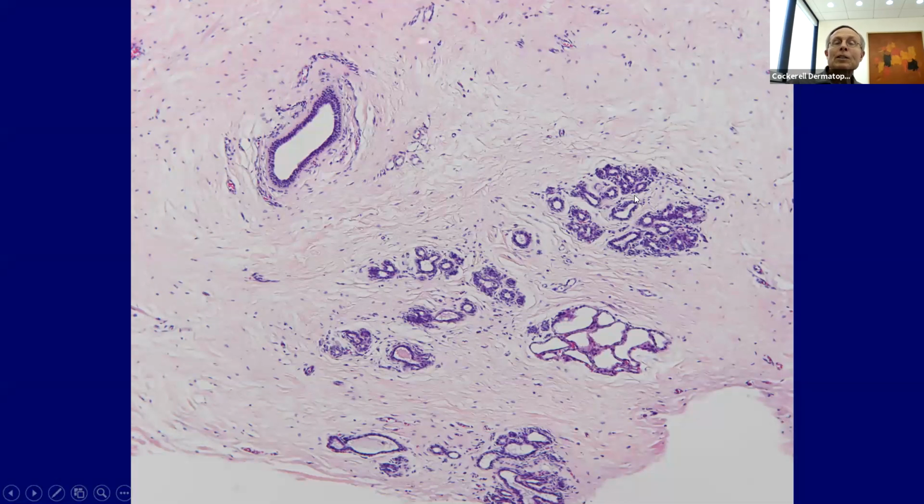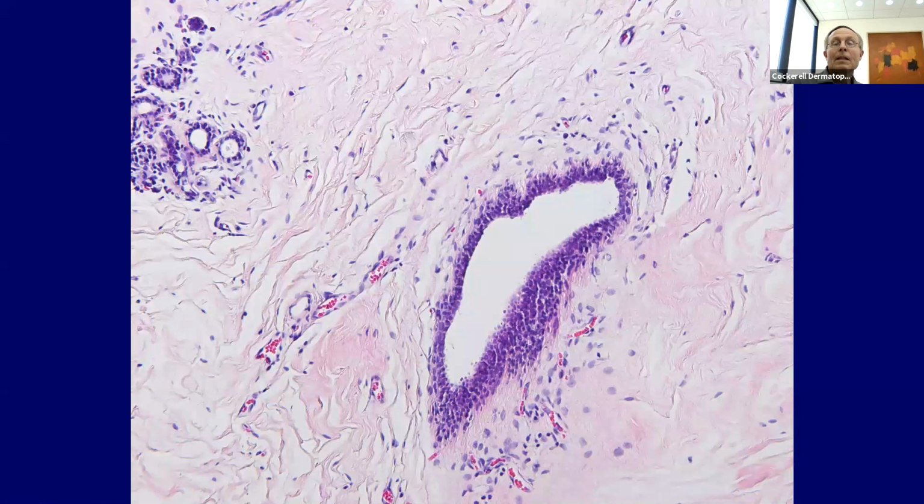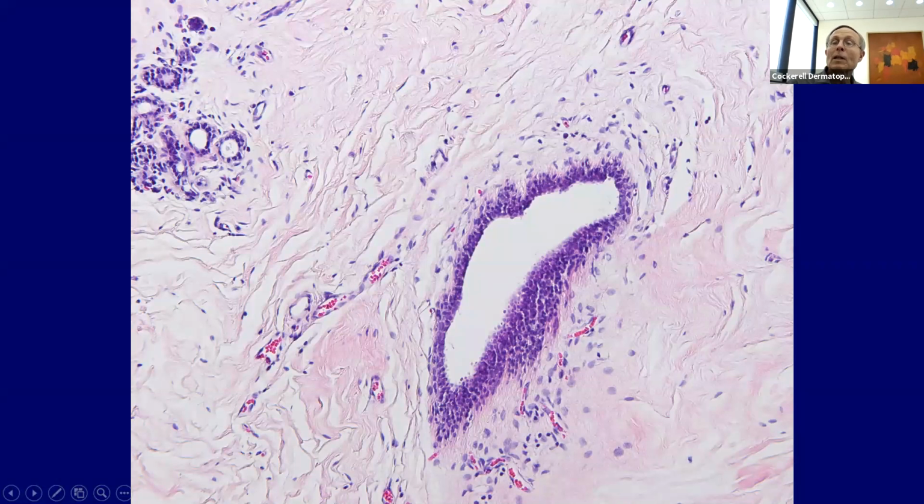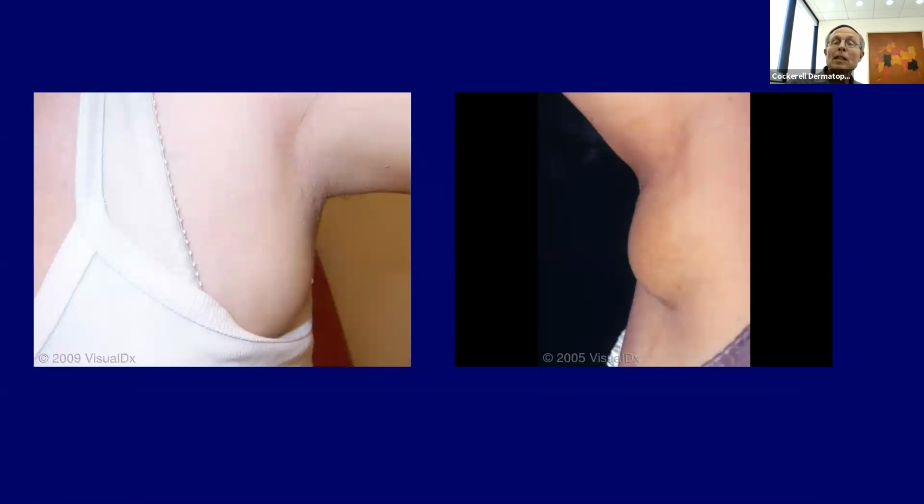Okay, so accessory nipple, somebody says, but there's one thing in here that you don't see in a nipple. So what are we looking at in this field that's not present in a nipple? And that is glandular epithelium. In an accessory nipple, you see ducts, you see the sebaceous hyperplasia, you can get the smooth muscle bundles, which we're not really seeing here, but you don't get this glandular epithelium. So you're right, it's related to the breast, but here we've actually got accessory breast tissue itself. So it's not just accessory nipple, it's breast.